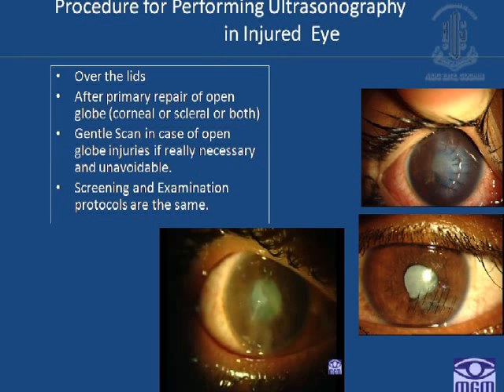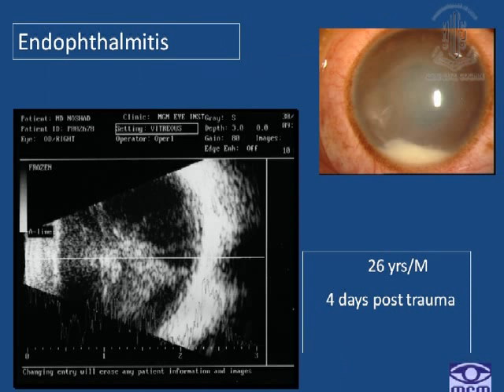So in my subsequent slides, I would be talking with examples which I have come across in my practice in the OPD, how I examine a patient of a traumatized eye. So let us look at this 26 years old male who had 4 days history of trauma with a wooden stick, and we did an ultrasonography and we related the clinical findings with the ultrasound. Mind it, you have to relate clinical findings with your ultrasonography.